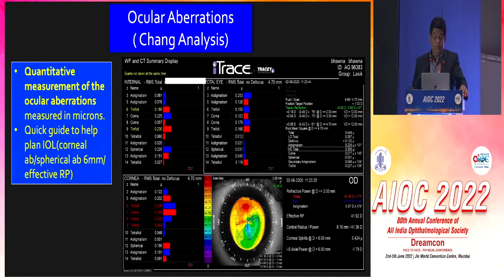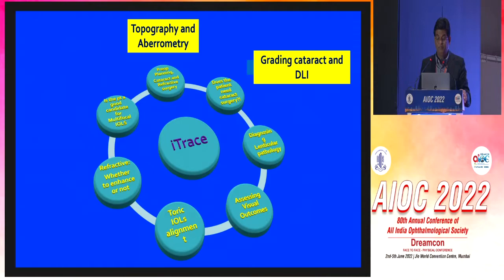And when we look at the Zernike analysis, so one was the wavefront analysis, we have gone into the Zernike analysis. So, this gives us something more quantitative. When we want to look closely at any of the errors, it will automatically show up that these values are significant in these patients. So, this will quantitate the whole thing. So, this also helps us in planning the surgery of these patients.